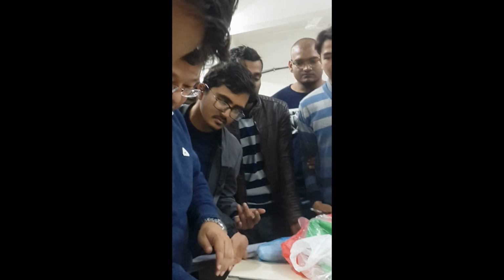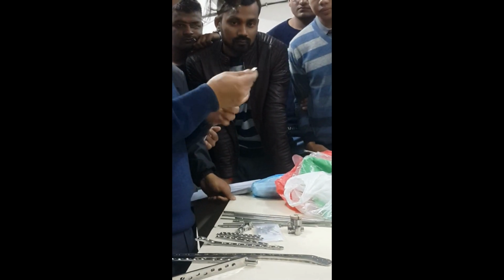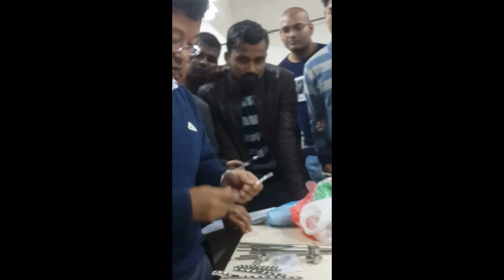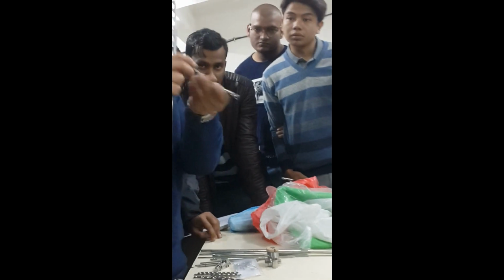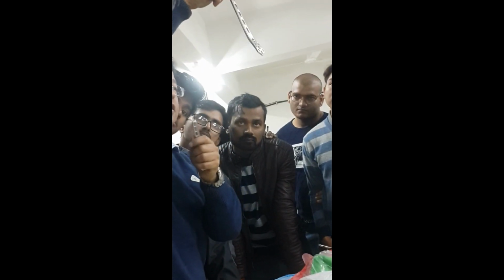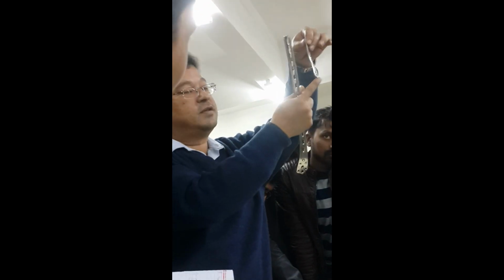Now we come to the other. So the locking compression plate can be of various types, right? Now this is for the tibia, a distal tibial locking plate, right? For the femur, this is like symmetrical, like this, and symmetrically it is flaring out, okay? On the tibia side, the curves are somewhat asymmetrical, okay? If you see asymmetrical, this is the distal femur locking plate, and this is the distal tibia.